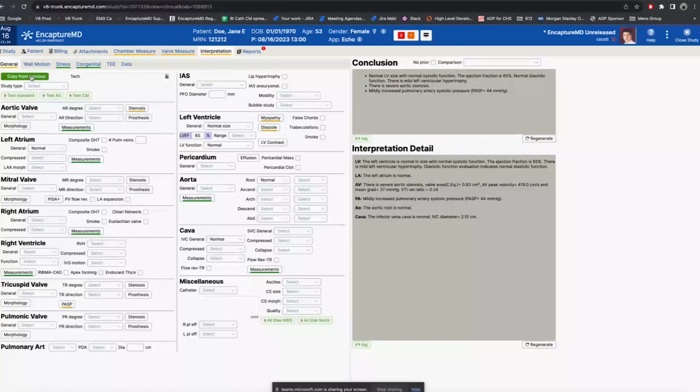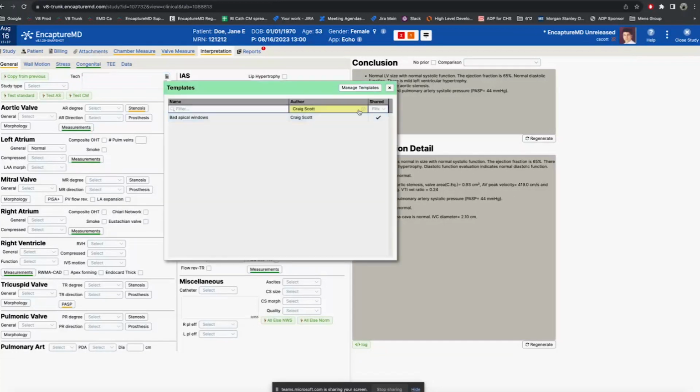There's also a place right here where the technologist can leave a note for the doctor. So some problem that they saw, and this will allow them to communicate without actually having been in the same room at the same time, which is often the case in these sort of workflows. We even have a templating system here so that you can add different phrases. Each tech can have their own phrases if you want. And we'll show you this template manager as we go along.